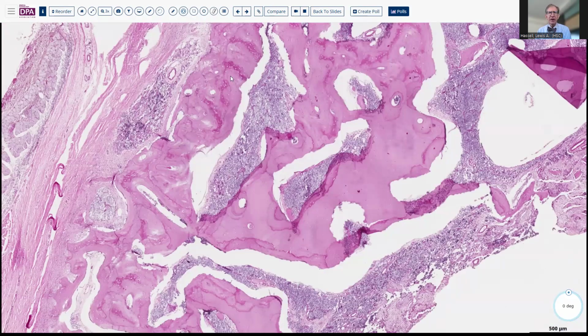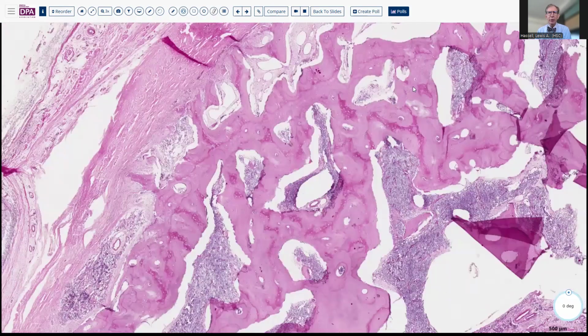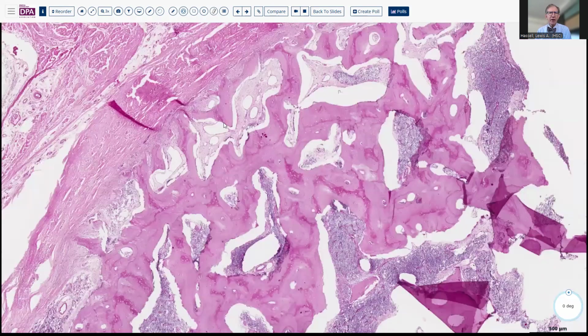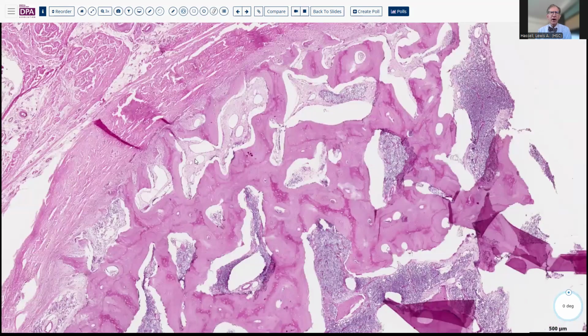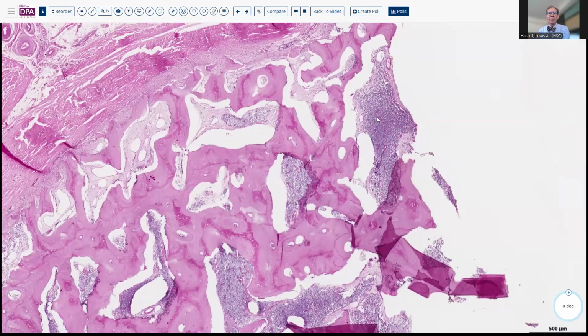The expansion in the periosteum enhances that appearance, and you end up with sometimes a sort of starburst type of pattern, although that's more characteristic of periosteal elevation with osteosarcoma than with Ewing sarcoma, which tends to give you more of a fusiform and longitudinal spread rather than the other.